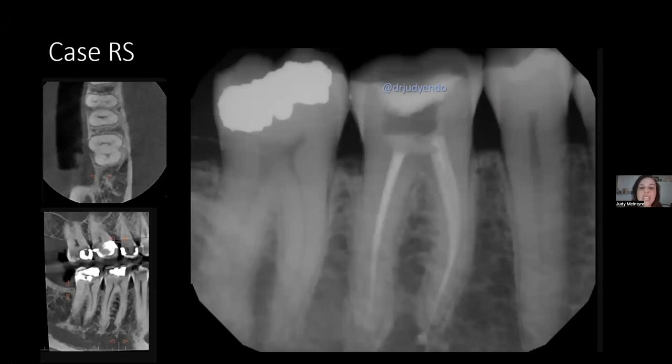And you can see that here is the root canal. With all of my root canals, I seal the gutta percha over so that there's no leakage, just in case the temporary comes out or anything else. And again, you can see on 2D that his horizontal bone is quite uniform.